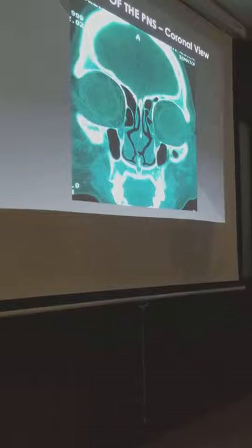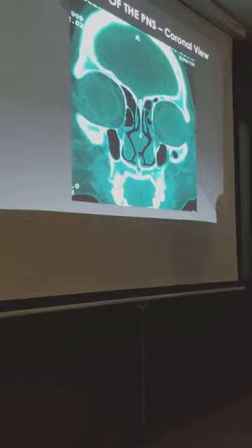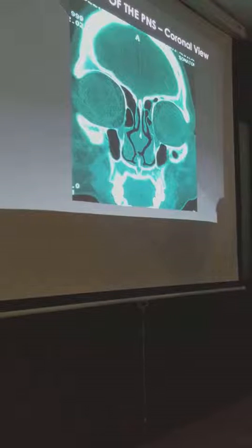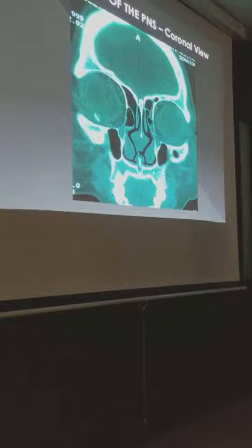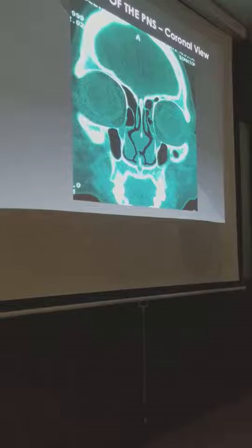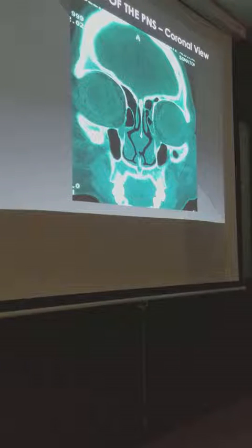See, I'm taking it one slide at a time, but you know, when you see that whole plate there in front of you, masusunod mo talaga. So, yung frontal sinus, sunod-sunod yan. Okay? So, the skull base is now becoming more apparent. But wag muna natin pag-usapan yan, but the anterior skull base is now beginning to become more apparent. So, that's the frontal sinus. Next slide, please.